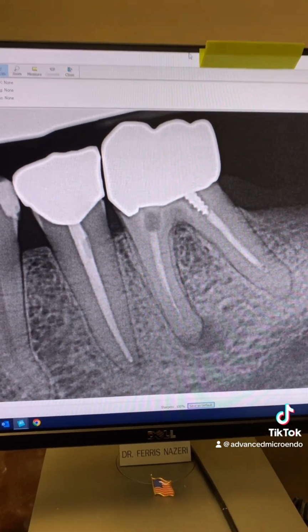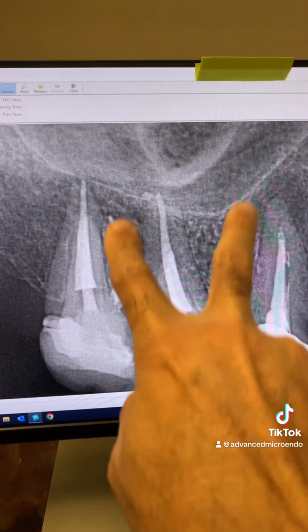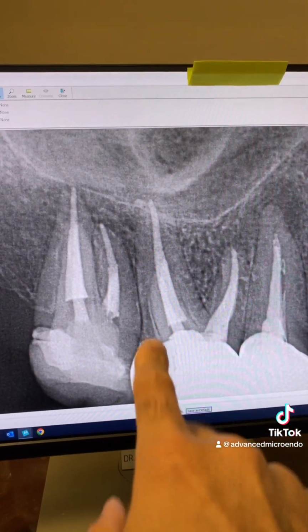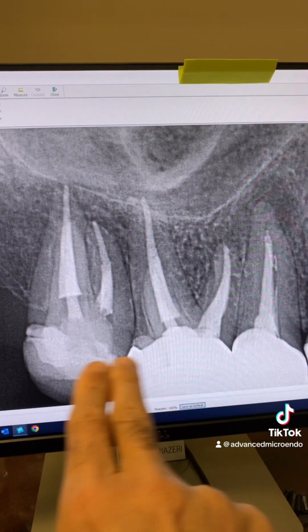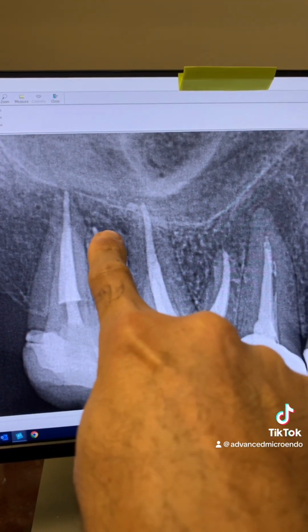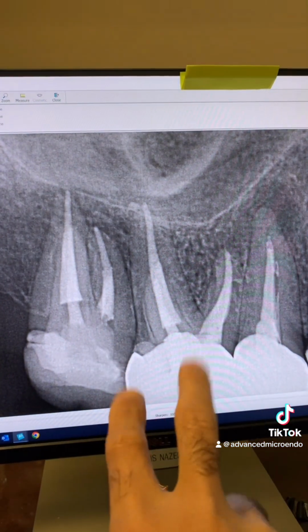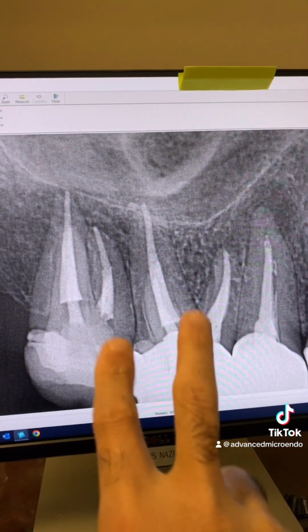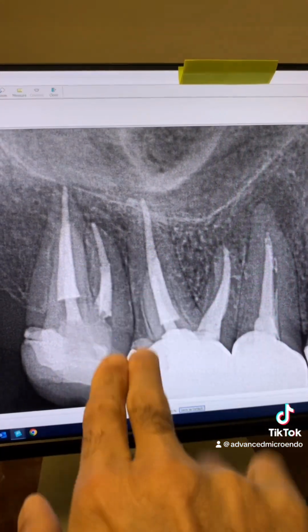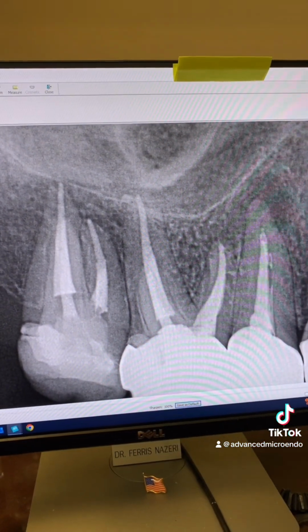All right. These two root canals were done here in the USA 2 or 3 years ago. The patient has no symptoms here. Maybe there's a periapical lucency there. I don't know. Percussion, palpation, all within normal limits. Maybe there's a little something here. So we'll keep an eye on these two teeth. I let the patient know.